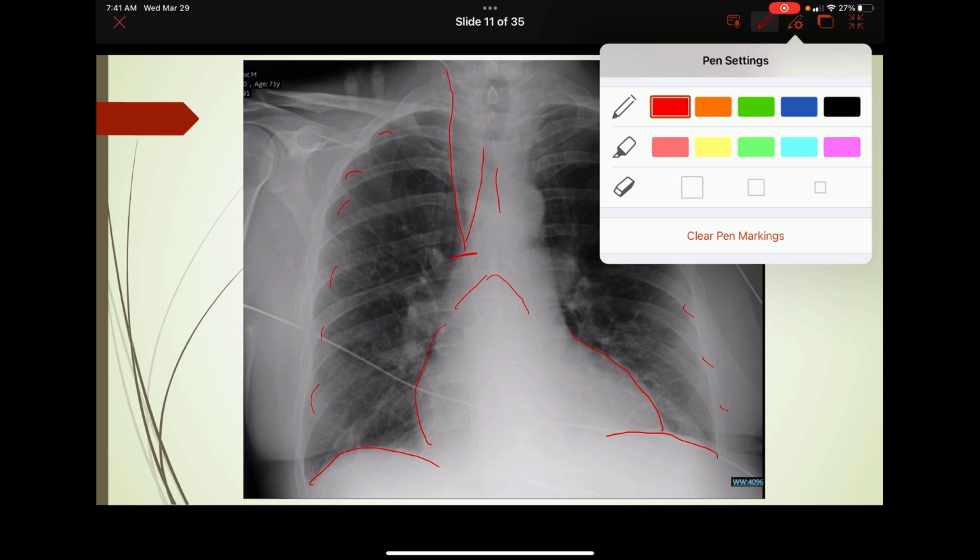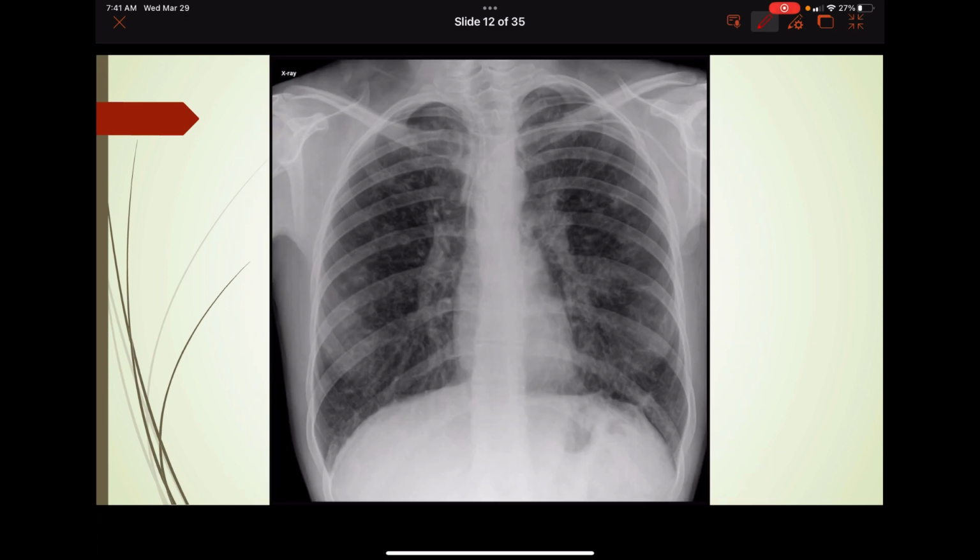Yeah, some of these images are mine, some I found on the internet. And another chest, A for airway. It's very difficult to see on this one. You kind of see the trachea coming down, then lose it. You can see the window right here, so most likely the carina is somewhere right around here. You can see the first rib here, second rib, third rib, fourth, fifth, sixth, seventh. So this is sixth, seventh, saying the carina is probably somewhere in here. So this first area is probably a little low.